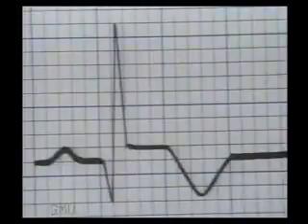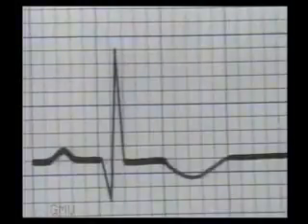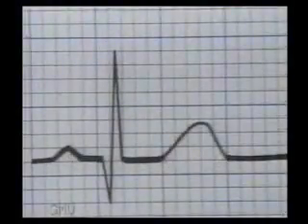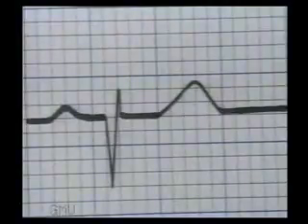The T wave is typically pointed and inverted with symmetrical limbs. In the third week, the Q wave will become fully developed and the T wave will gradually become flat and start returning to normal. By the end of the 3 months, the ST segment and T wave will return to normal and only the Q wave will remain permanent. Of course, if the size of the infarct is very small, the Q wave may completely disappear. Now let us see the same changes in a lead with negative QRS complex.